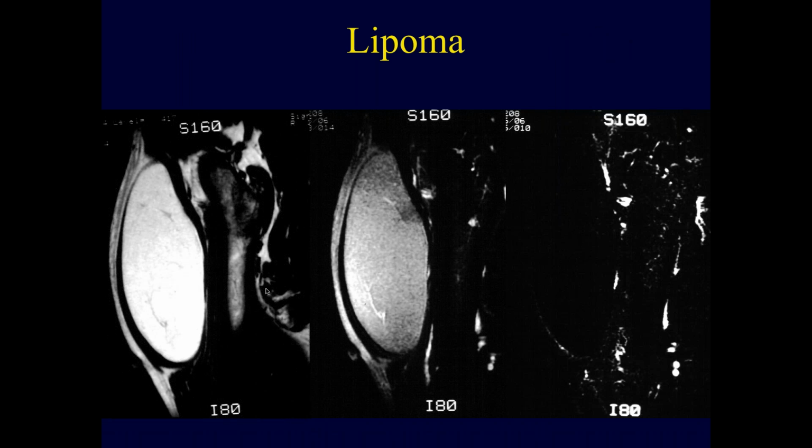Yeah, the lipomas can become very large and benign, and there are rare cases that I've seen and that have been described in the literature where you can have complete uniform high signal intensity with sharp margins on the T1 weighted images, and histologically they find sarcomatous elements within them. These are extremely common. I know I've seen patients that have had 30 or 40 of these in their body. Overall, I think 99% of the time, if you see a lesion that's completely uniform and bright on T1 weighted image with smooth margins like this, you can reliably, comfortably call it a benign lipoma. And I have done that for many years now, and I've not had one that turned out to be malignant, but they have been described.